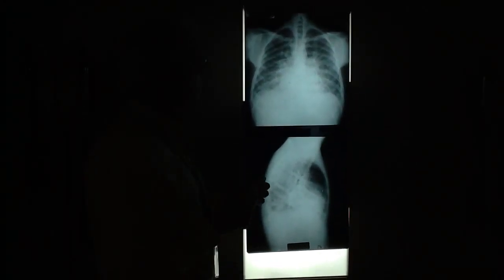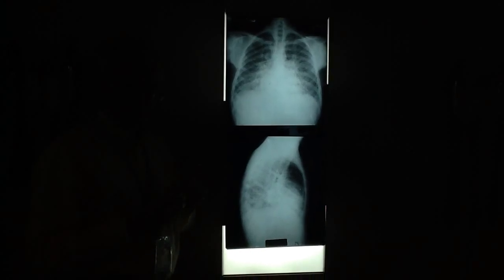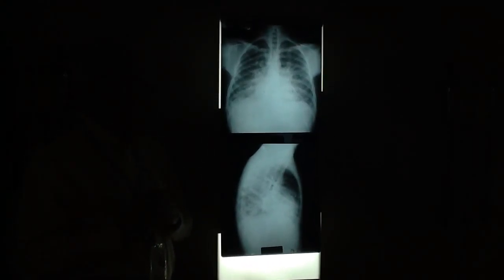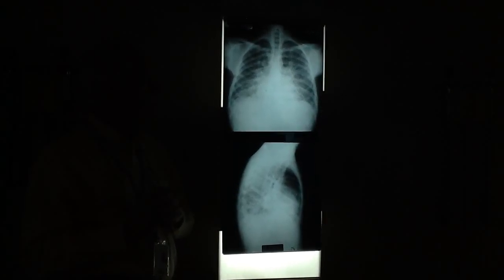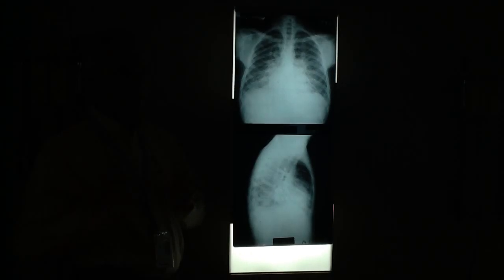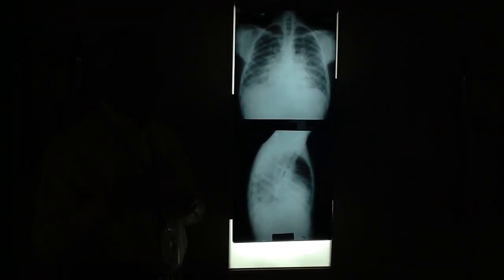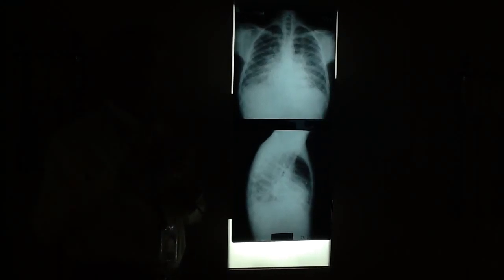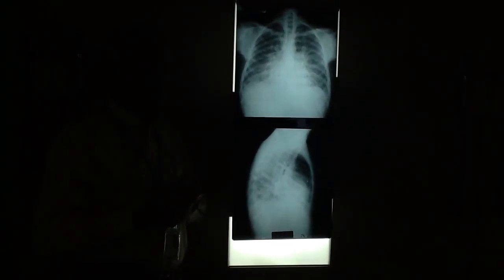Example, though, of big hilar areas. Everybody agree? Big hilar areas? Okay, so bilateral hilar enlargement. Agreed? Okay, so what are the possible choices? Bilateral hilar enlargement, 1, 2, 3. What are the choices?